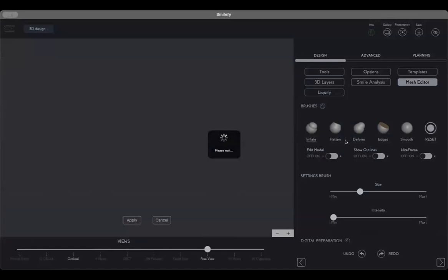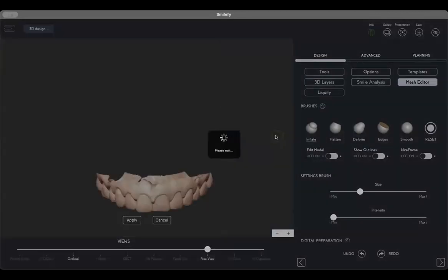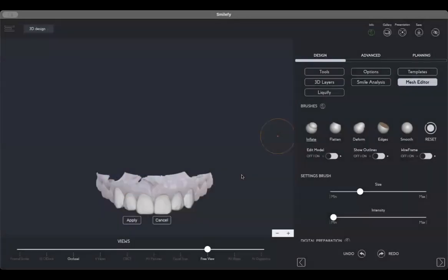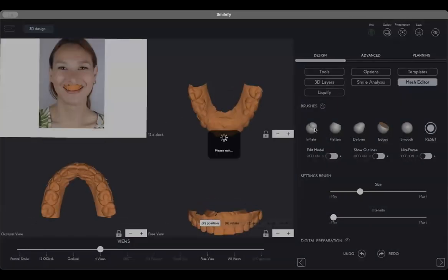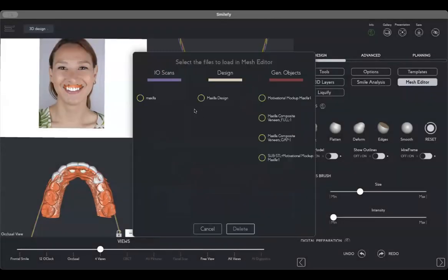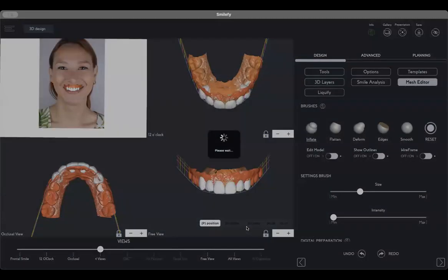If you want to reduce digitally, delete the composite veneers digitally, there is no tool in the world that protects... actually, let me show you. Let's do something else. Let's select the mesh editor, only with the maxilla. So let's say that's my design, that's my scan.